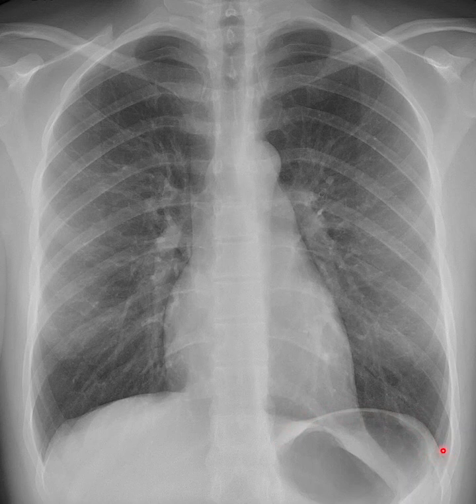And then let's go back up top and look for the trachea. The trachea will be centered down the spine here. That gray area in here is the trachea. And we can follow the trachea down to about level T5, T6, thoracic vertebra levels T5, T6, to find that bifurcation of the trachea called the carina. That's where the trachea branches off into the right and left bronchi. So we look for that little area right in here called the carina.